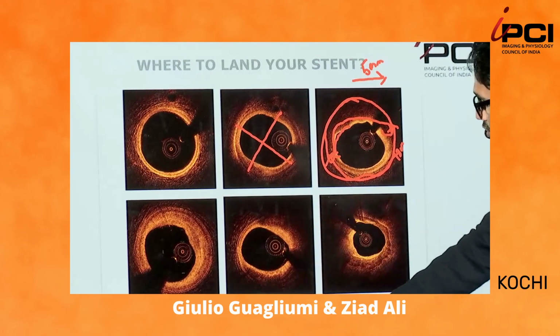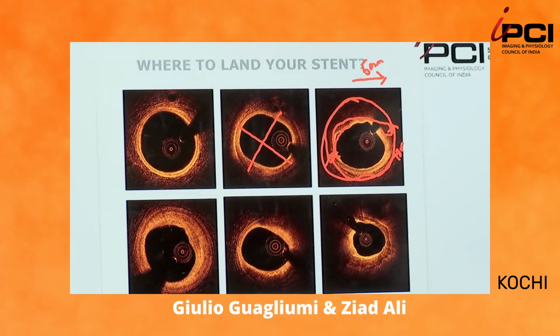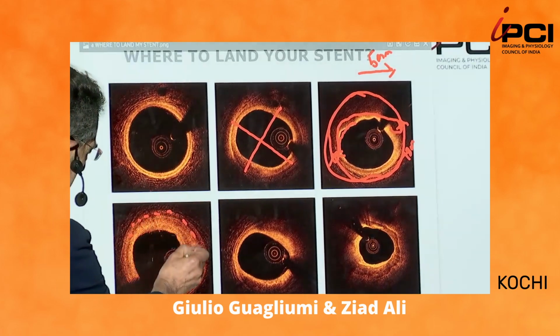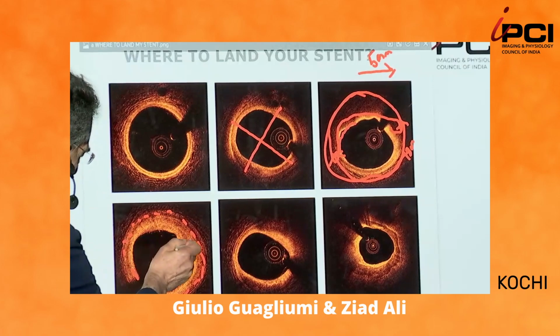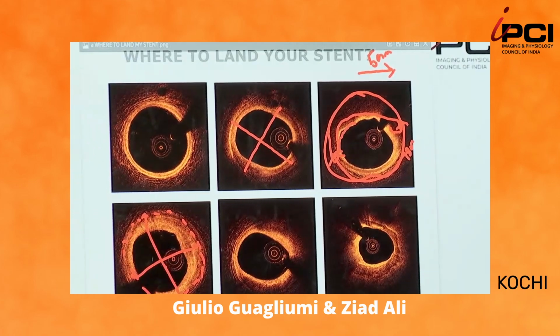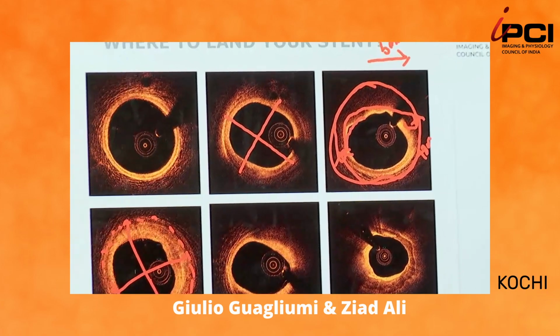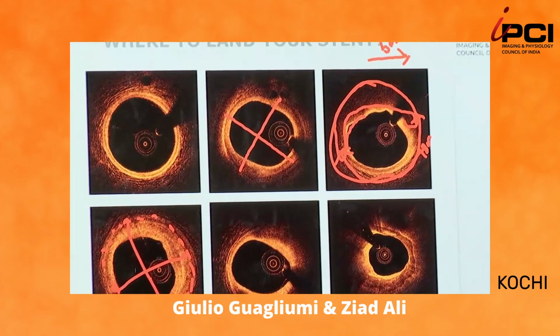Well, what about you, Giulio? Are you happy to land into fibrous tissue? Absolutely, yes. We can measure, and you can just dot the EEL, and then you can trace in both diameters, very important. What about calcium? How important is the lumen area? Because we are detecting calcium automatically. You can see what is important to get when we have calcium in front.